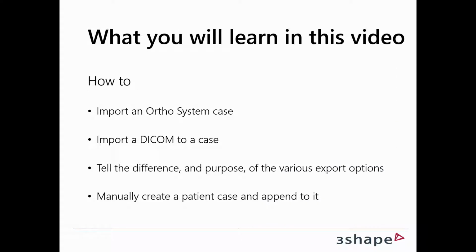So what you'll learn in this video is how to import an ortho system case, how to import a DICOM to a case, tell the difference and purpose of the various export options, and manually create a patient case and append to it. But enough about the preliminaries, let's have a look at how it works in the ortho system.